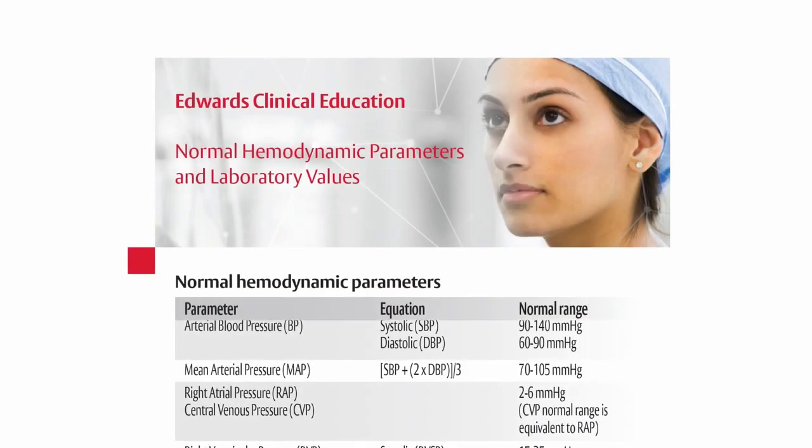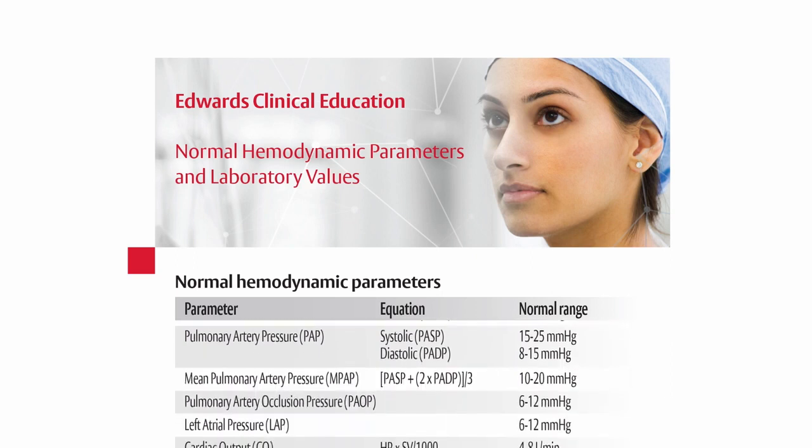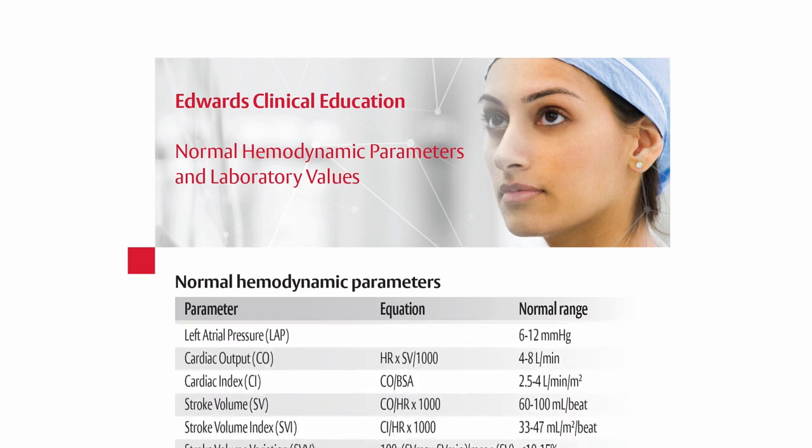After the average of the series of boluses has been accepted, use the cardiac output values as part of your patient's hemodynamic profile.